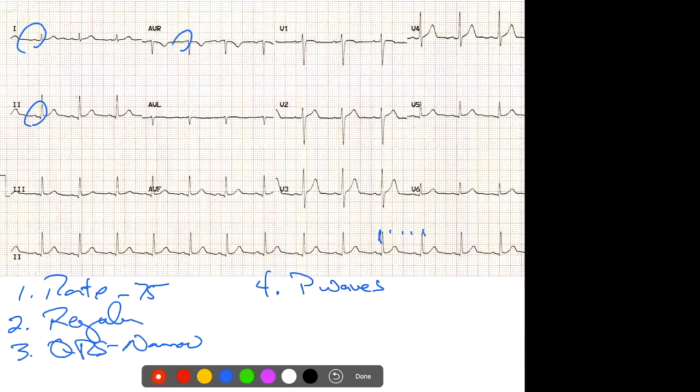Mr. Roberts, yes. Where you counted off down there at the bottom and got 75, what if you were to do it up at the top? Because then if you would have done it towards the top of the lead 2, you would have got a little bit off of 100, maybe like 90 or something.